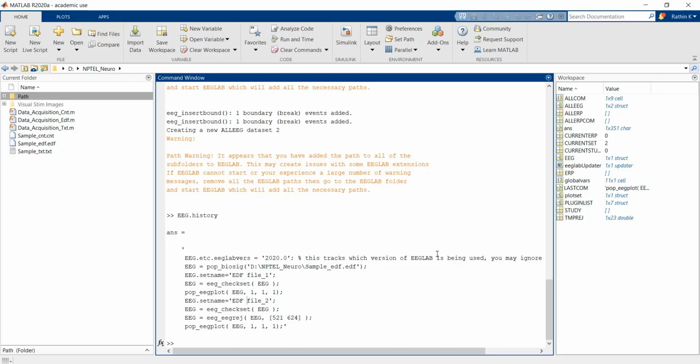The clear reason behind that is that stimuli generation is mainly done once for an experiment, whereas this is signal processing, so it should be done for multiple subjects very easily. Every time you will not be there to perform GUI operations and see the final data. It will be time consuming. So to avoid that, for batch file processing or multiple subject signal processing for EEG, what we basically use is scripting.